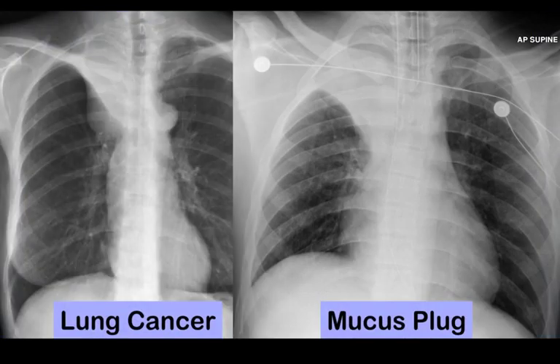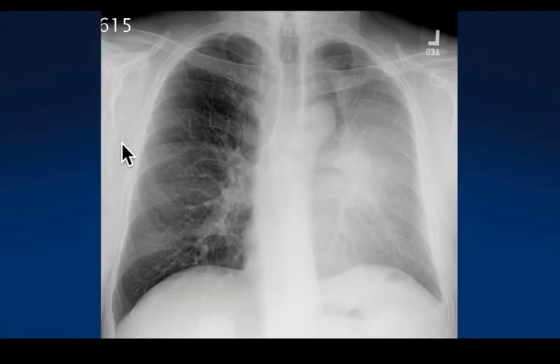If I compare and contrast right upper lobe atelectasis secondary to a large central cancer resulting in an S sign of Golden to that of right upper lobe collapse caused by mucus plugging, where there is no central mass and no extrabronchial extension of that mass, it tends to have a more curvilinear shape or sometimes a more abruptly triangular shape. But it is this lateral inferior bowing of the fissure that would suggest the presence of the central obstructing mass and the reverse S sign of Golden.